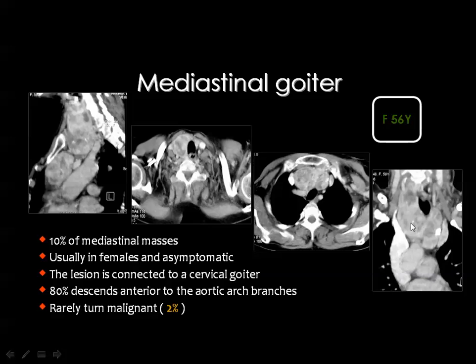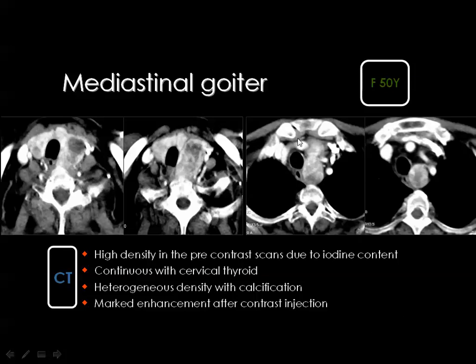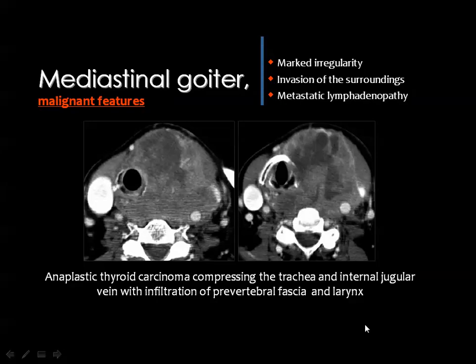They contain multiple hypodense colloid nodules as well as foci of matrix calcification. Then you see here the thyroid gland, both lobes are enlarged. The left one is more enlarged than the right one, and you don't see the sternum. Then you cannot judge the retrosternal extension unless you see the sternum and you see the thyroid which is behind the sternum. Then you know that there is retrosternal extension.